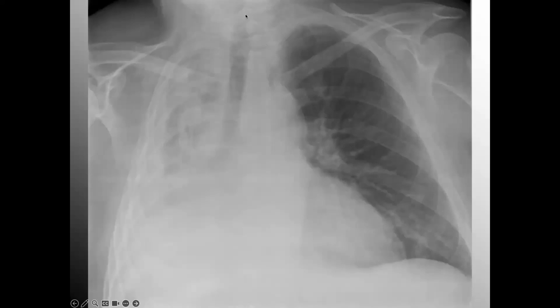Here is your midline, your spinous processes of your vertebral bodies. So we're way off. We're way rotated towards the right. Your clavicles, although the clavicular heads are aligned, notice the acromial end of the clavicles. My left is much more elevated than my right. So this patient is malpositioned in the bed. That's my bones part. We already established airway is offset towards the right. I don't see any obvious breaks, fractures, fissures.